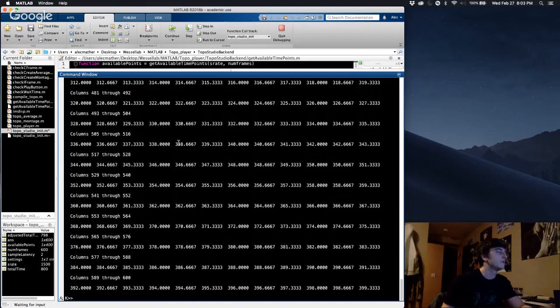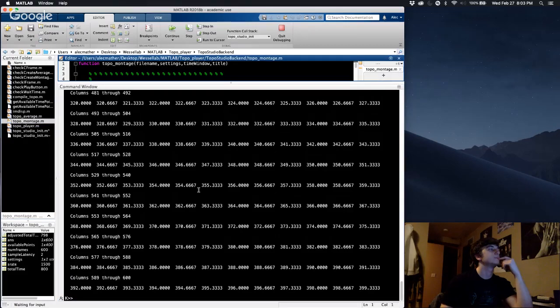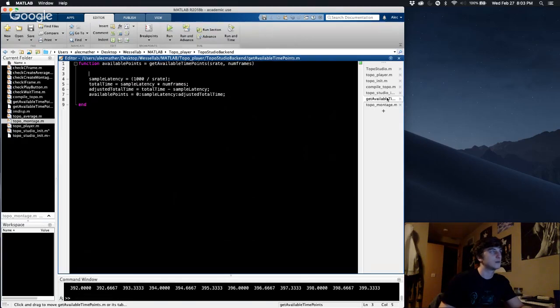So when we play, or when we get our montage, or when we get our average, we need to say something that says, hey, we didn't find a time point at that, but we found one at something else. So let's quit debugging here.